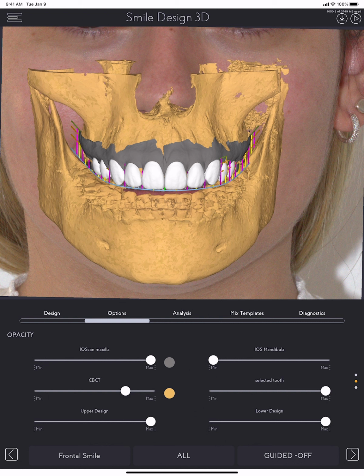We also have an intraoral scan. The CBCT will allow you to visualize the position of the bone crest in comparison with the cervical margin of your 3D design. And the intraoral scan will show you the soft tissue that you want to remove in this procedure.